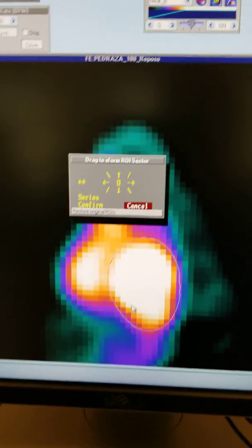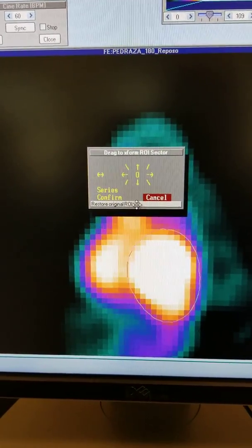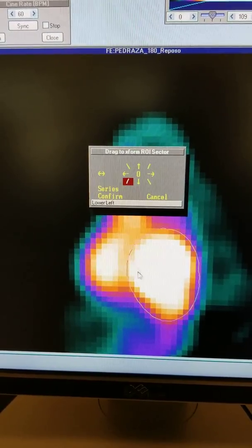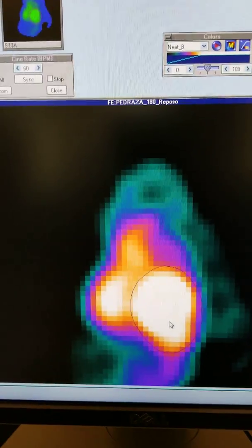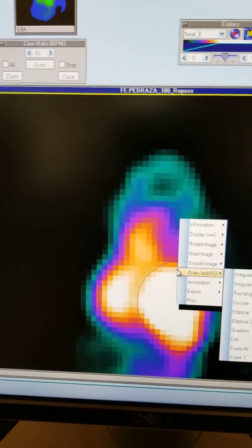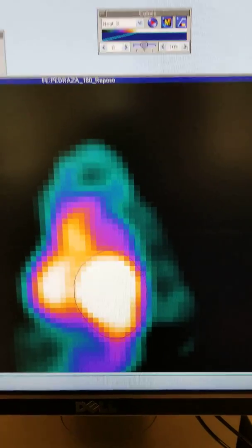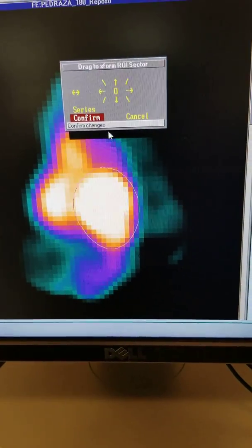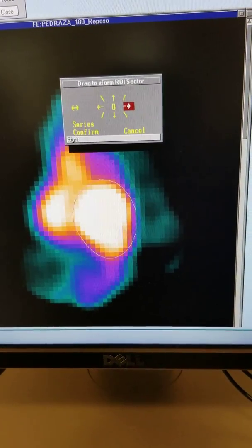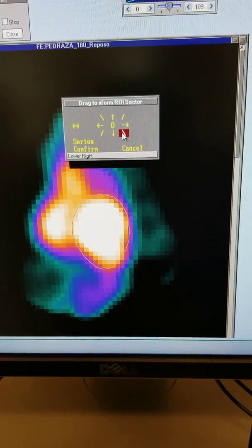Bam. Okay, so there's not a ton of adjustments that I want to do here, simply because the editing software is a little outdated. It will not apply to all of the images, okay? So we're happy with this. We feel good about it. Resize, pardon me guys. We're pretty okay with it. We feel pretty good about it. It's not going to get perfect. If you try and stay and make this perfect, you will totally blow your 22 minutes.